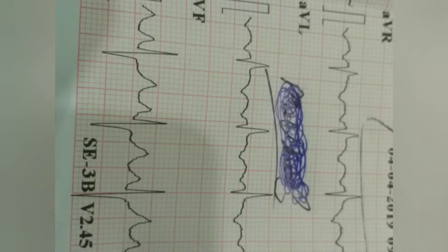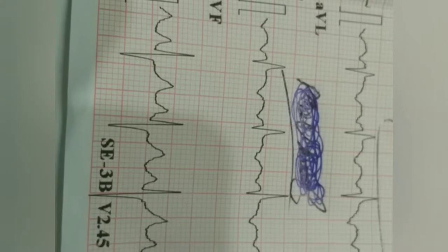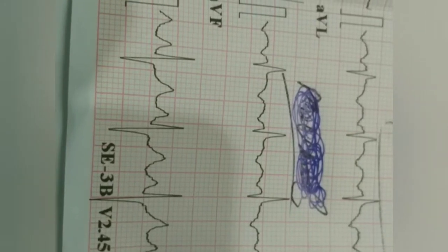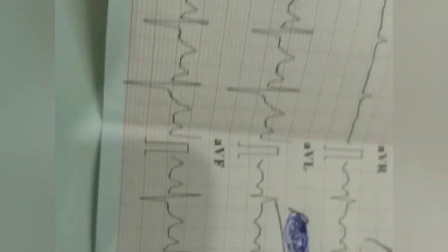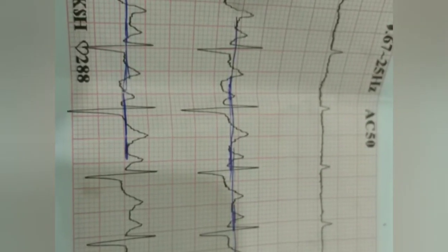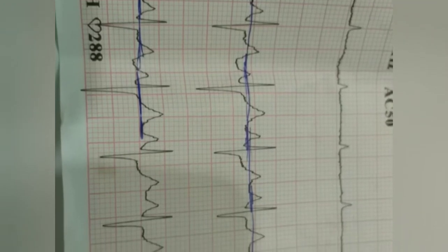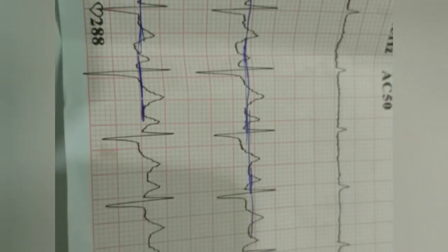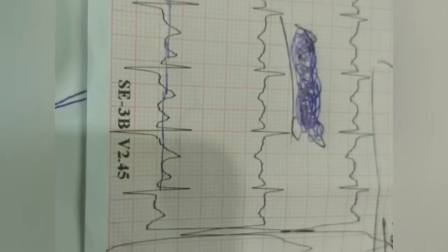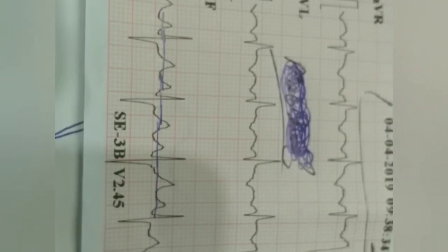And if you try to focus on the ST segment, is it not going down, or depressed one small box? The definition is that the ST segment is depressed if it is one small box or 1 millimeter lower than the isoelectric line. Look here now, again try to focus, then you will see that indeed the ST segment in leads 2, 3 and aVF, which are looking at the inferior wall, and that inferior wall is being supplied by the right coronary artery, in them there is again a very subtle or slight change, and that is ST depression.